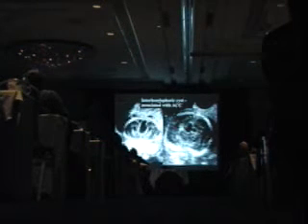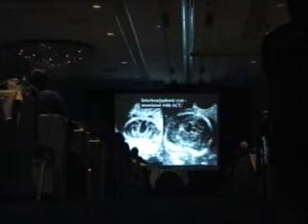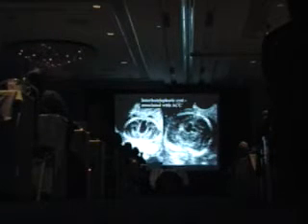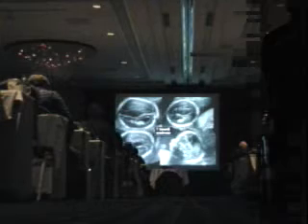It is really separate and can be shunted separately. When the arachnoid cyst happens along the falx, and it's called an interhemispheric cyst, it's invariably associated with agenesis of the corpus callosum. Here are two different cases. And when you see the cyst in between here, and then in between there, you can count on there being agenesis of the corpus callosum. You won't see it because this sits right where the corpus callosum is supposed to be, but you know that the corpus callosum is missing.